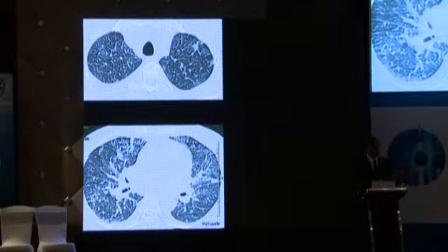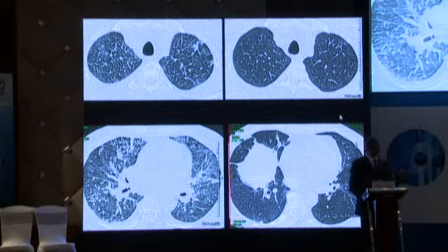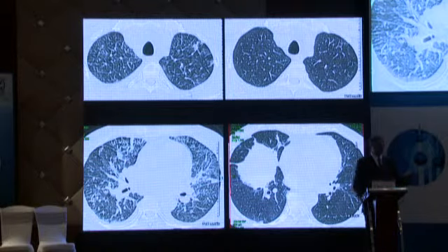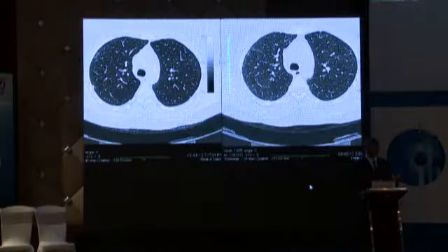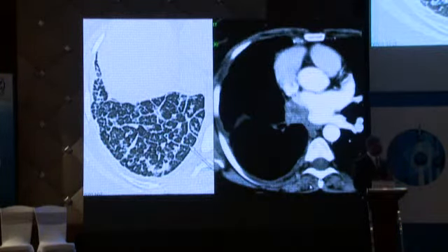That doesn't happen together. So here is a patient who has left-sided failure. 24 hours later, I was able to get this patient back in because the referring doctor was a friend. The patient was given diuretics, and in 24 hours, the effusions have disappeared and the septal thickening has gone as well.